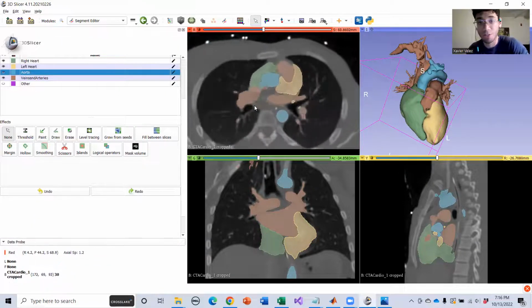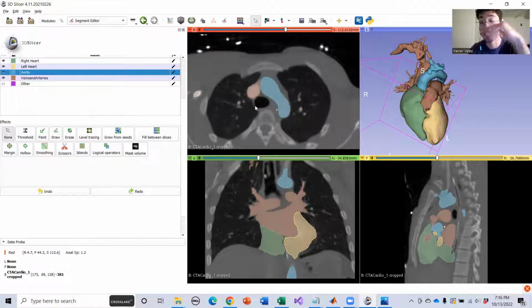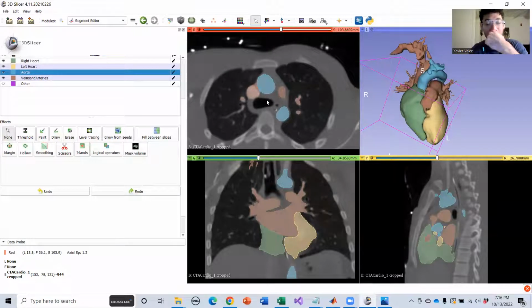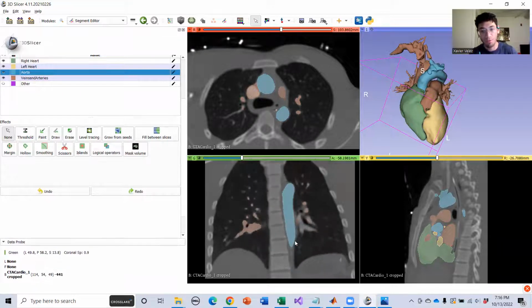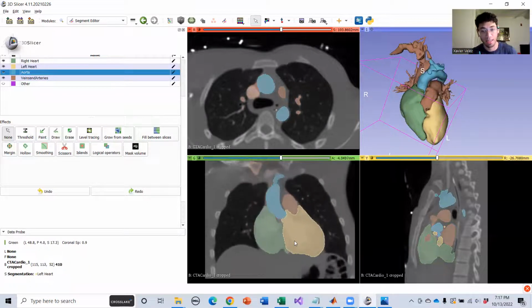Maybe there are more efficient ways, but I've found after doing the DICOM kidney project, I have found time and time again that if you want something really detailed, you're going to have to go frame by frame and make sure it is what you want it to be. So, for example, I like to use this bottom left screen. I think it's probably my favorite screen, right?